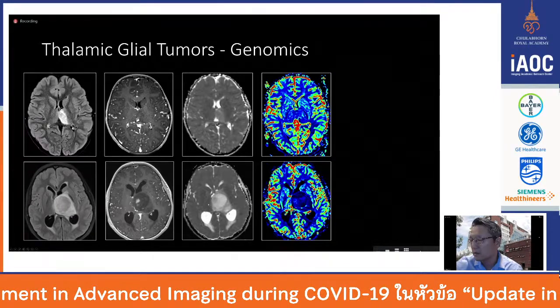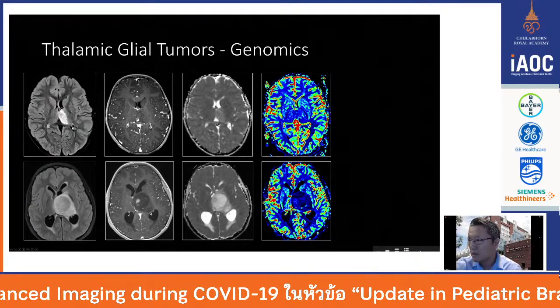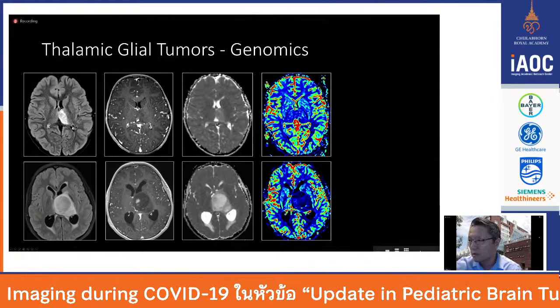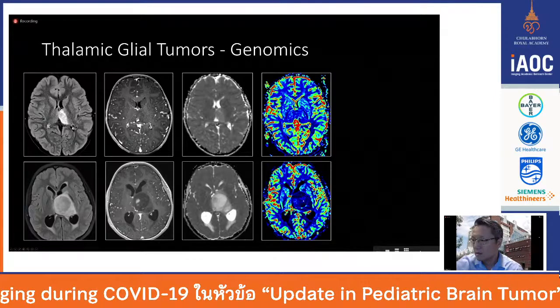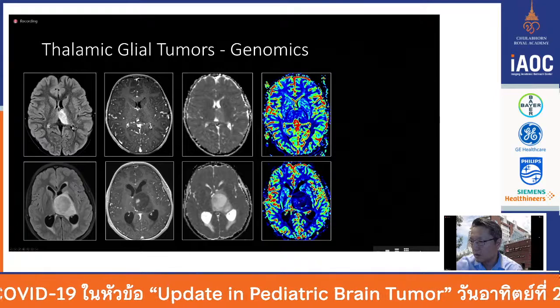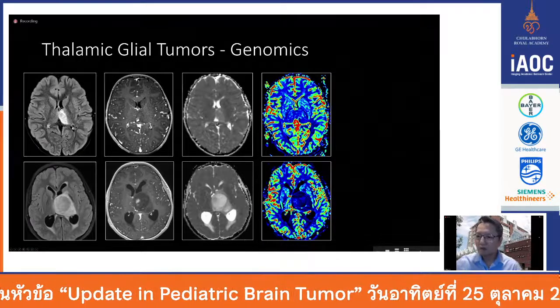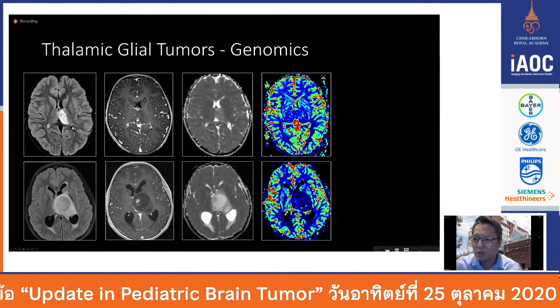And then here are some cerebral blood volume maps from DSC perfusion. Again, really no increased perfusion compared to the other side, almost decreased perfusion, even though the central nodules do have somewhat increased perfusion, but certainly not that much increase. So you would think that these tumors would be very similar, right?